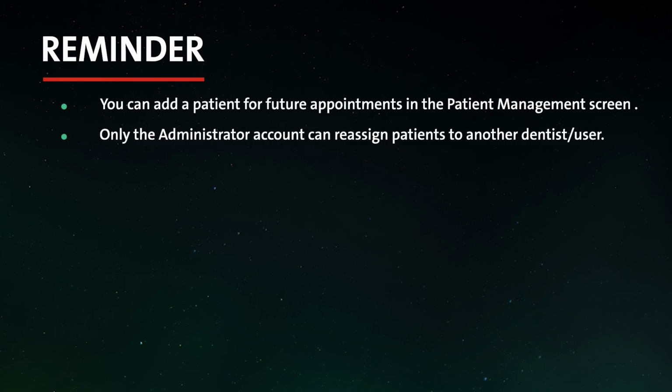Reminder: you can add a patient for future appointments in the Patient Management screen. Only the administrator account can reassign patients to another dentist or user.